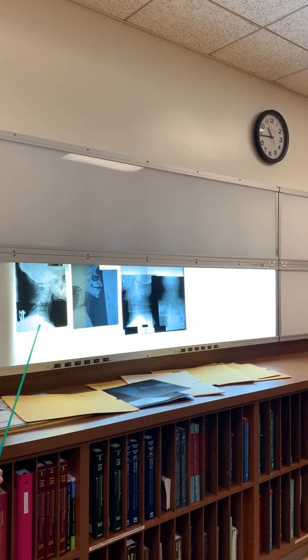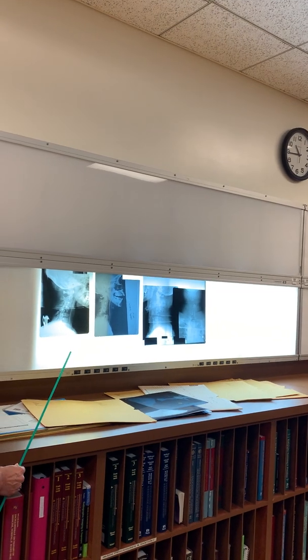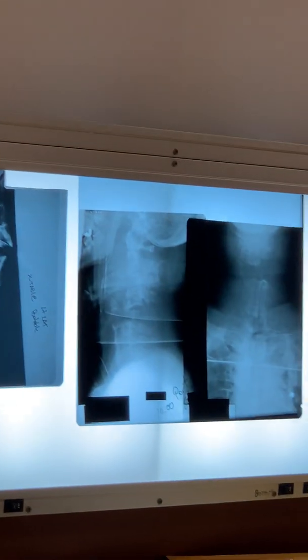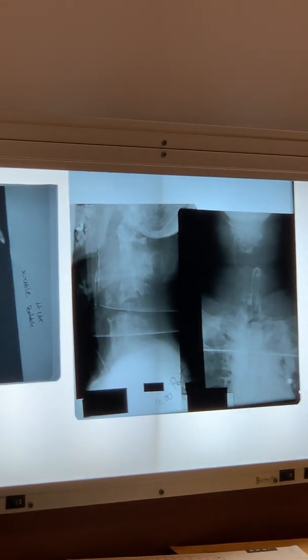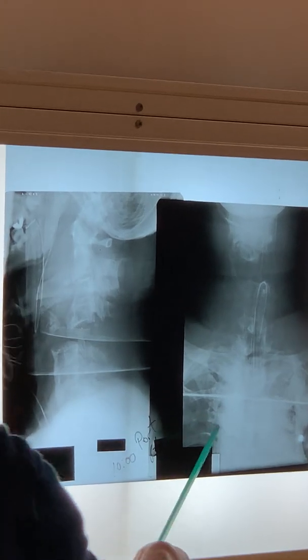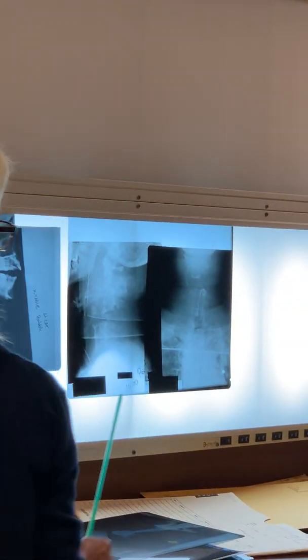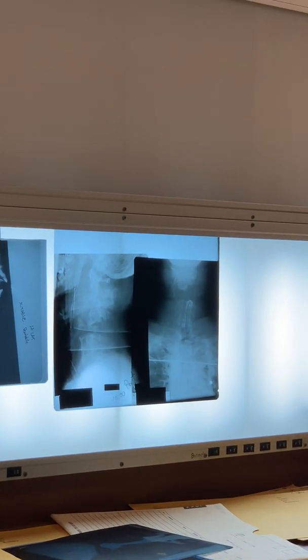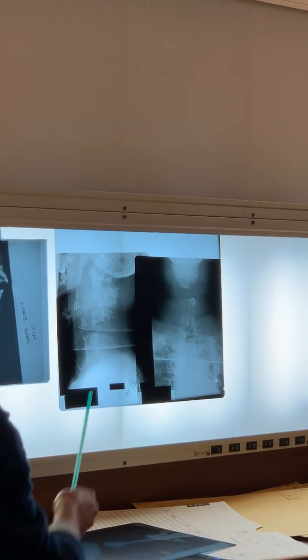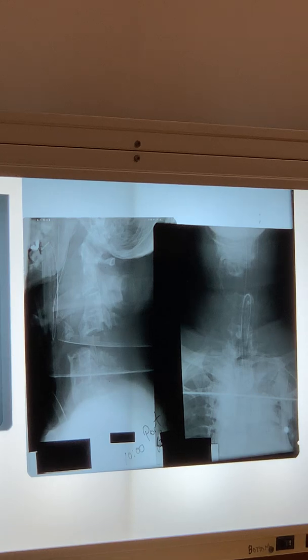Was she cut when they found her? No, she wasn't cut. She was just snapped. And obviously they didn't know that it was snapped. See how they tried to go in here first, and then I guess they went in this way? That's her hyoid bone connecting stuff. It's gone. Oh, they used to write on there when it was portable. Yeah, that was sad.